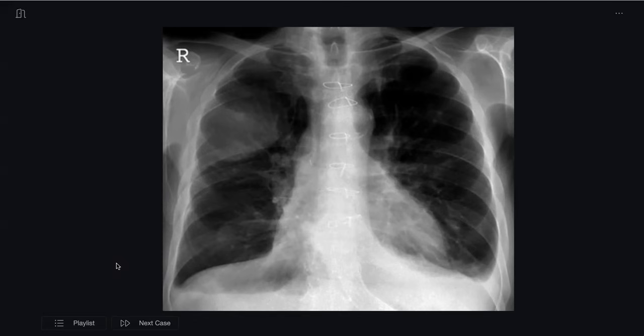For the primary, I would like to look at the CT images. This is the film that you require, nothing else. Apart from this, the apices are clear. There is some lucency here in the left upper zone. Review the apices and the retrocardiac area. The retrocardiac area appears unremarkable. CP angles I have already commented upon. I would also like to look at the bones. Here I could appreciate that the overlying rib is also showing lytic destruction. Yes.